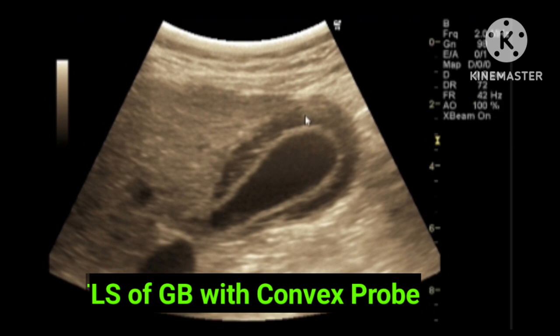This slide, a longitudinal section of the gallbladder with convex probe, shows the sandwich appearance of the gallbladder, which means all three layers of the gallbladder are easily visible. The outer layer is hyperechoic, which is due to the serosal layer itself. The middle layer is hypoechoic, which is due to the muscular layer itself. And the innermost layer is hyperechoic, which is due to the mucosal layer itself.